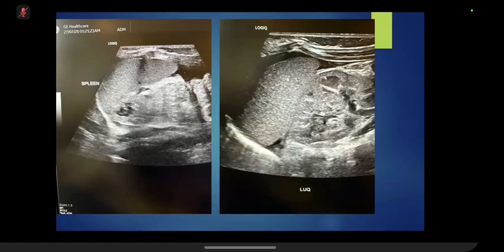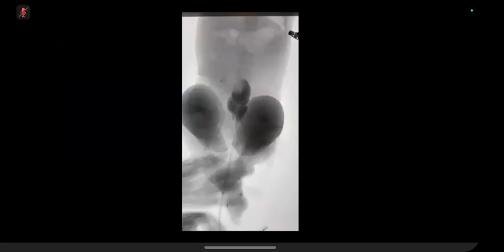One big thing to notice in all these fluoroscopic images is that there was no extraluminal air. There was no extraluminal contrast. Try to repeat these things when you are telling the examiner again and again, because they are the safety findings. They want to listen to these findings so that they can give you good marks and they can make you a safe radiologist.